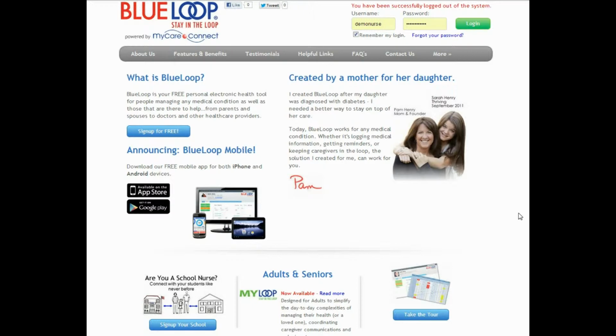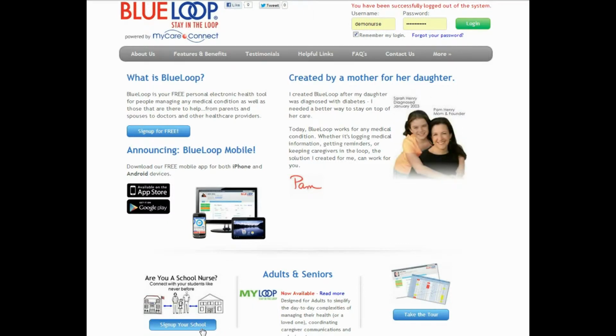So first of all, if you go to our homepage at MyCareConnect.com and click on the BlueLoop logo, you will be taken to this page. Down at the bottom, you'll see that it says Sign Up Your School.